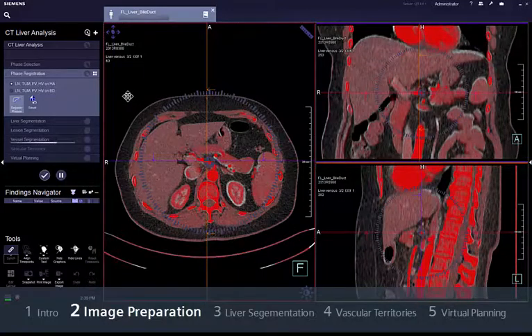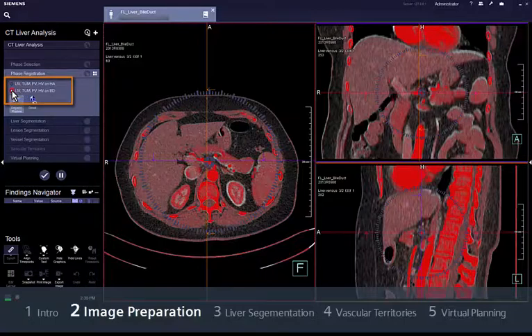Select the phase options you need to align. In the most typical case, only the portal vein phase has to be aligned with the arterial phase, so only one option is available. In case you are using just one phase, for example the portal vein phase for LIV, HV or PV, no alignment will be necessary. Since the bile duct series also has to be aligned here, 2 options are available.